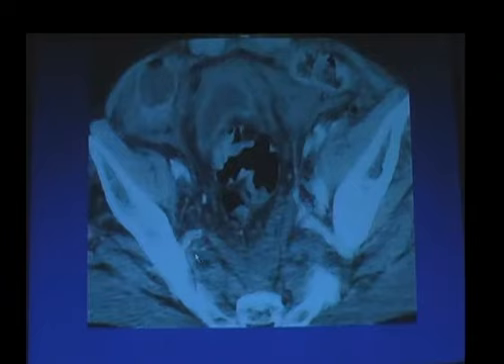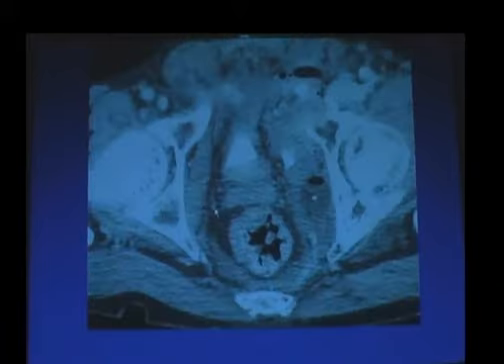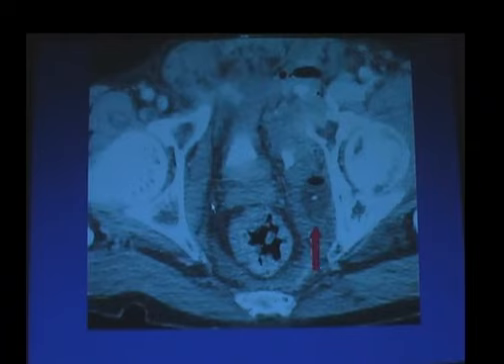And this is another patient who came in with multiple pelvic fractures. Again, you can see the large amount of blood down into the pelvis. As we scan more inferiorly, what you can see is that the Foley catheter ended up in the left side of the pelvis. And so I like to show this case to caution you, if you are going to do a CT cystogram, make sure that the patient does not have a urethral injury. Make sure the urethra has been cleared before someone starts to stick a Foley catheter into these patients to check the bladder.